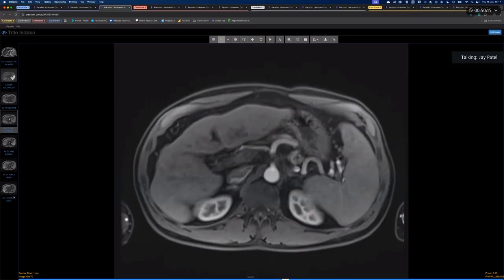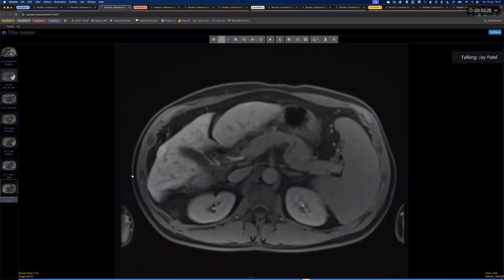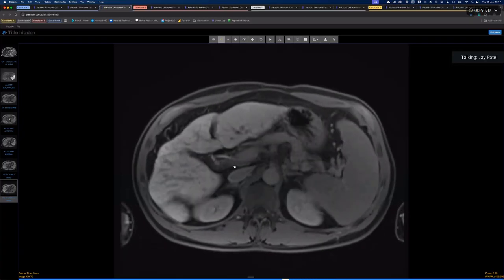We then go through and there's a portal venous phase, a slightly delayed phase at 2 minutes, and then a 20-minute scan. And on this phase, there is contrast. So Primovist studies, you were right. Primovist studies, there is a delayed acquisition.